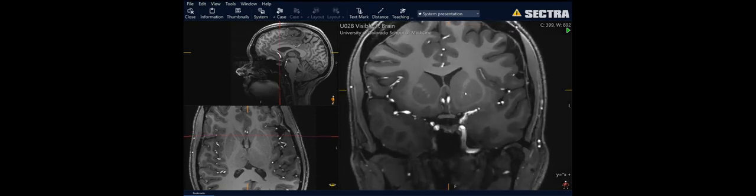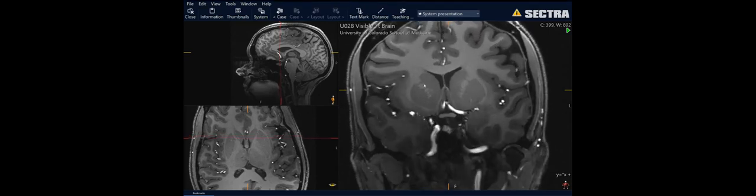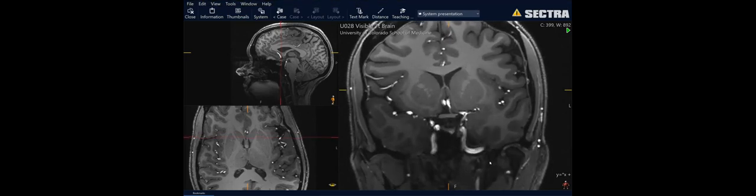So the internal capsule, let's take a look at the axial view. If we can blow this one up, let's just pop him on there. Remember that internal capsule has a V shape. So it has an anterior limb, genu or bend, and a posterior limb. So what we're looking at in that coronal is the anterior limb of the internal capsule, with a small portion of that rostrum. Putamen getting larger. Appreciate the lateral sulcus with branches of the MCA.